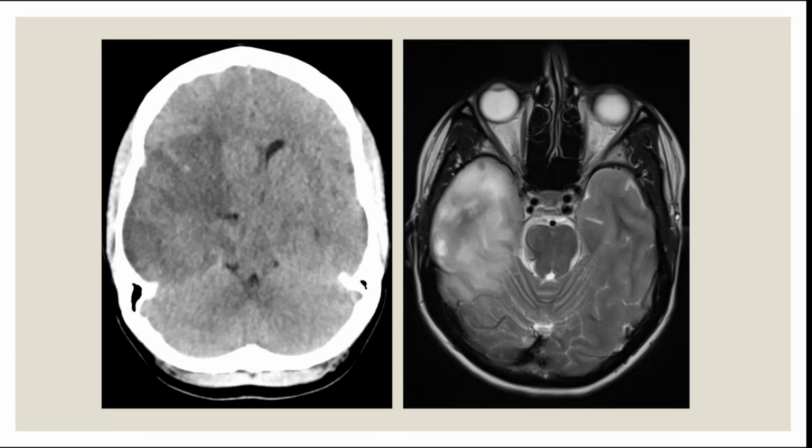Okay, so maybe we can go to another image. There are two images, so tell me about both of them. Again, you don't have to tell me the exact diagnosis, but what do you think?